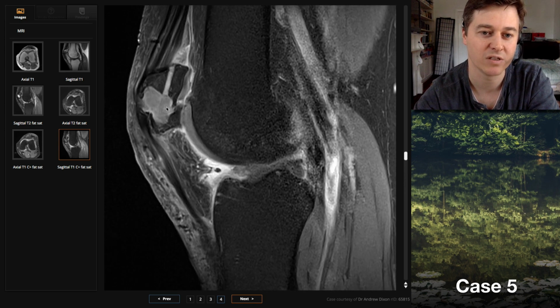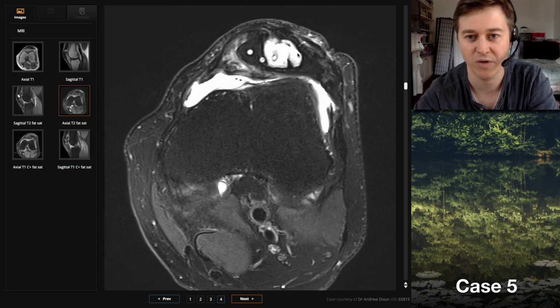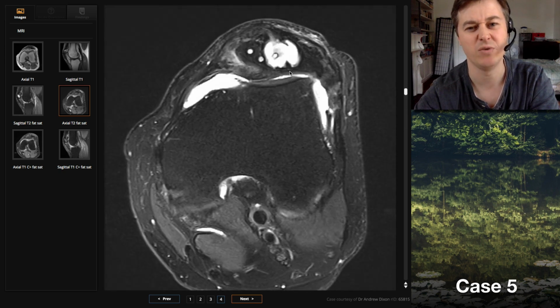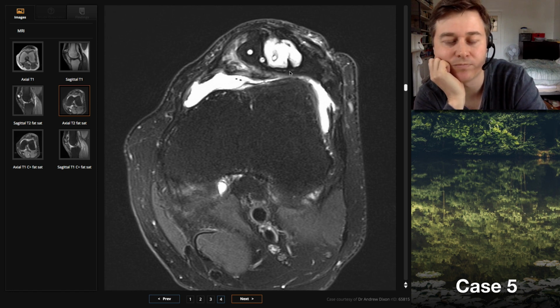So assuming this looks like it probably is an enhancing lesion in there, and it's got no real edema, it's got a narrow zone of transition and probably that sclerotic margin as we saw on the CT and the plain film. So does that help you narrow the differential, or still pretty similar?